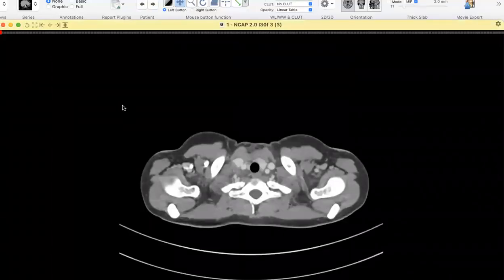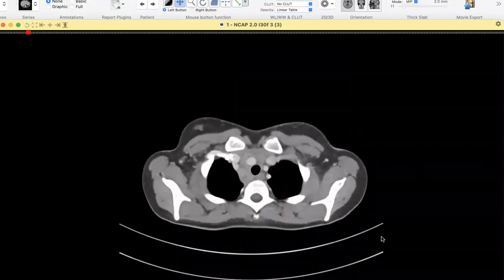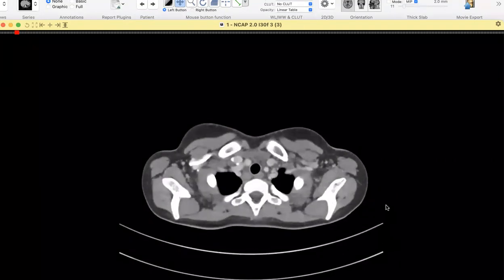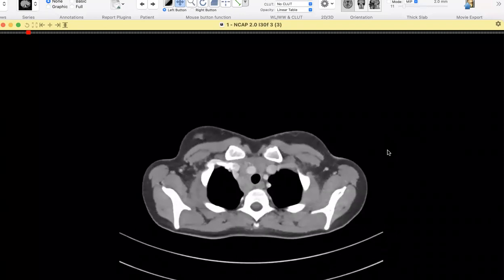Yeah. So can you just scroll? Yes. No, it is static, I think. Yes. Okay. The other way. Yeah. Okay. No, this is the same patient? Same patient. Yeah. We've done the CT for her. Okay. I don't know why it is not going. One second. Can you use the arrows right and left? Okay.